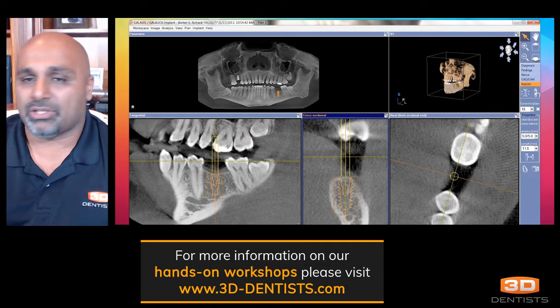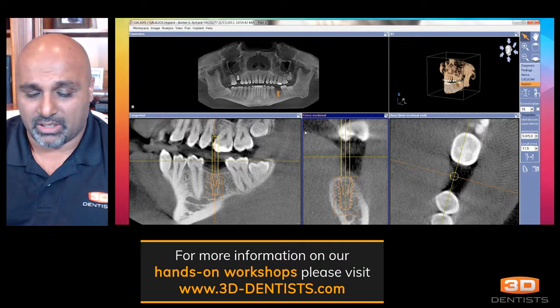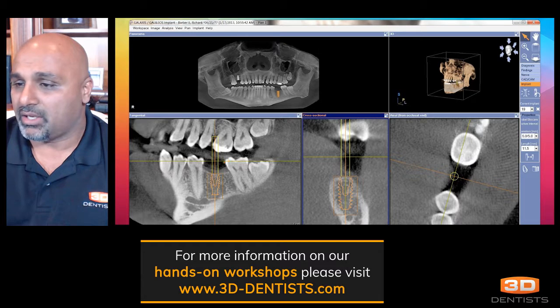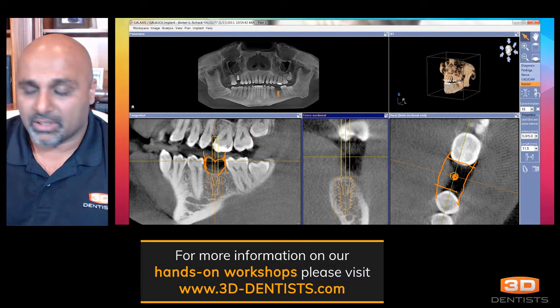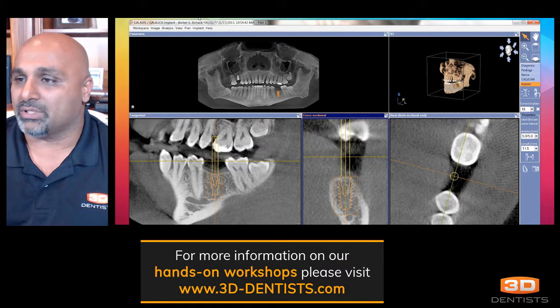So here is our restoration fixed. And what this again will show us is here we have good access, a well-centered restoration, minimal food trap, plenty of running room to design, and then we are well-centered between our lingual wall, buccal wall, distal contact, and mesial contact. We are well centered there, leaving us everything we need for a good result.